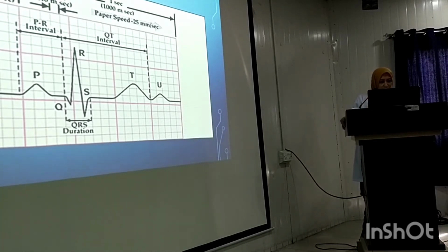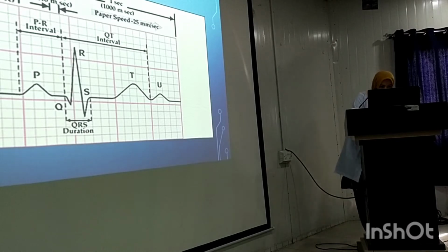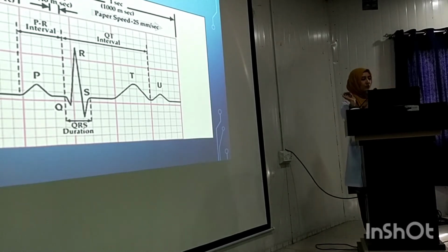Before I move to the next slide, please appreciate that there are some large boxes in the ECG strip and then there are some small boxes in the ECG strip. Are you all able to appreciate the large and small boxes? So it's important. Small boxes and large boxes.